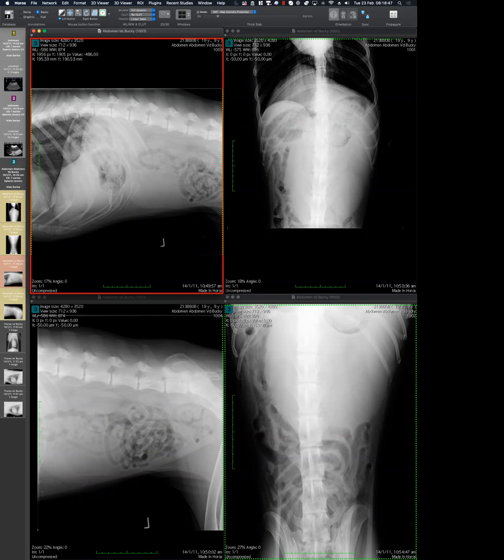What about the pancreas? Yeah, the pancreas is another good one. I agree. So the left limb of the pancreas sits exactly there. So it's connected to the stomach, connected to the colon. The colon seems to be coming this way. There's a little bit of colon here, and it seems to be also displaced somehow. So yeah, very good point. Anything else?